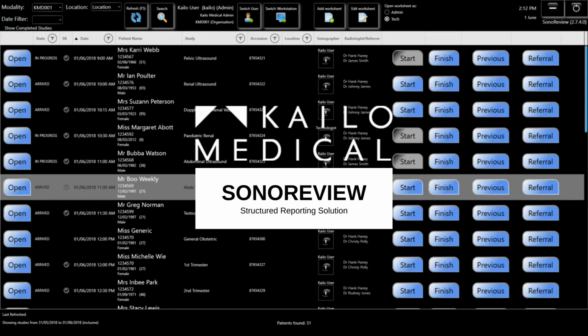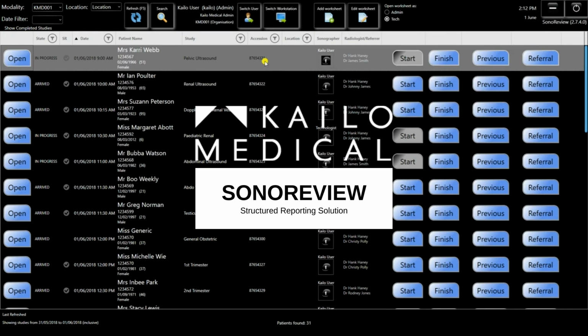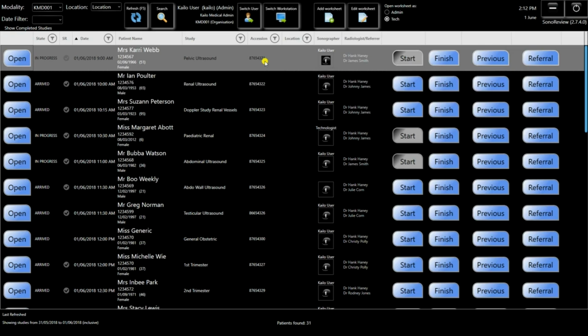Hello there and welcome to a short demonstration of SonoReview, Kailo Medical's all-encompassing structured and automated reporting package. Today we'll take a quick look at key features within SonoReview, namely the ability to review prior imaging.